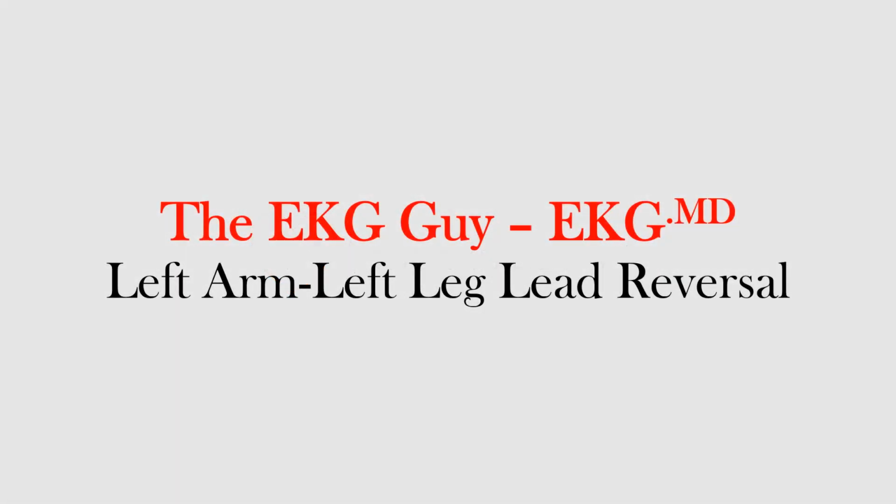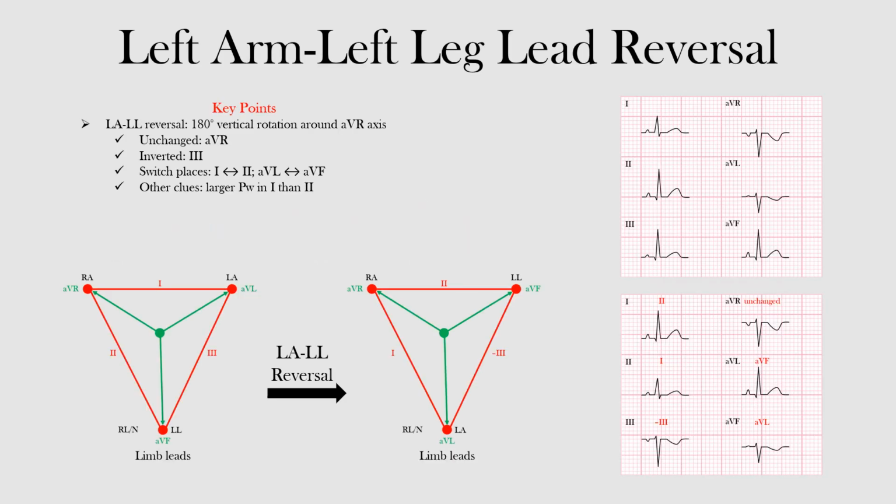In this lecture, we will discuss left arm, left leg lead reversal and how to identify it on the EKG. Making sure that the EKG leads are connected to the correct electrode position is important for getting accurate rhythm strips in 12-lead EKGs. If the leads are reversed, we call this lead reversal and can often produce EKG abnormalities. It is important to be aware of these accidental misplacements of the limb lead electrodes because they may mimic various pathology, including chamber enlargement and ectopic atrial rhythm, or even myocardial ischemia and infarction.